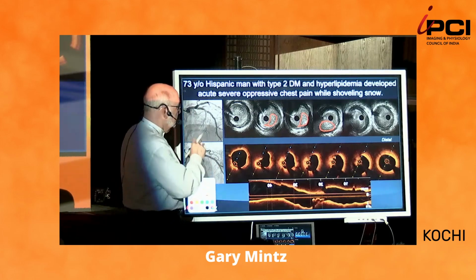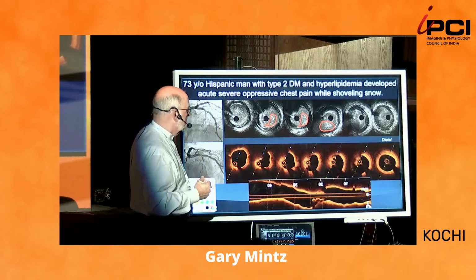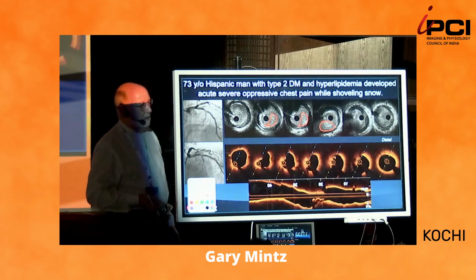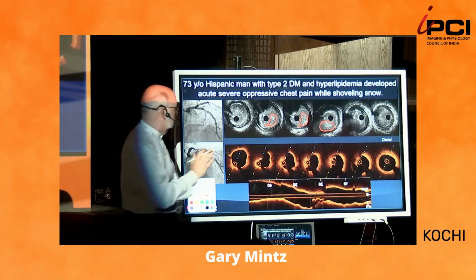But every so often you see this. Now, if you are trying to distinguish, I was listening to the previous talk, distinguish between thrombus and blood stasis, what's the simplest thing to do? A little bit of saline, a little contrast, a little saline, it'll get rid of the blood.